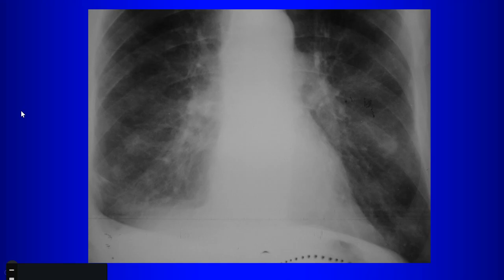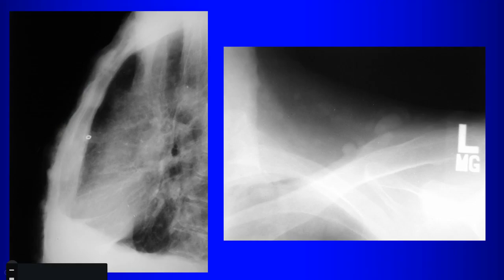Okay, the finding here is bilateral nodules. What a surprise. Another case with bilateral nodules, okay? Show you some more images on this case and you see what? Pleural-based nodularity. Is he correct? Are these pleural nodules? Yeah, so they're actually not in the lung, right?